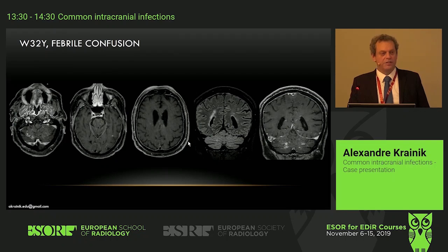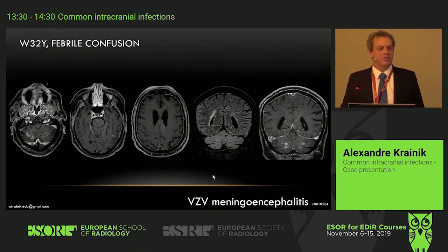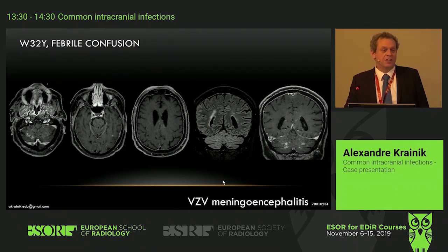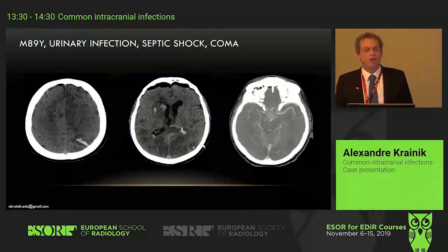And then you may be affirmative that it's a meningoencephalitis related to varicella. Hard to check, huh? It could be meningeal as well. Bacterial as well. Another one.